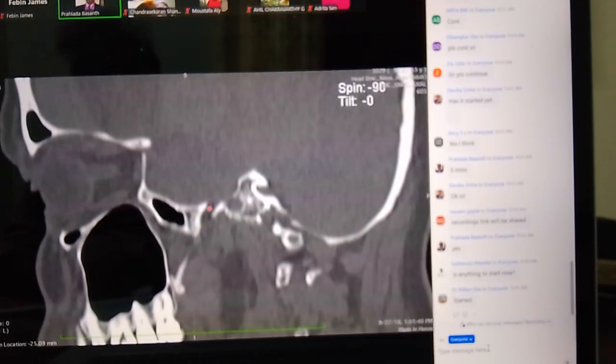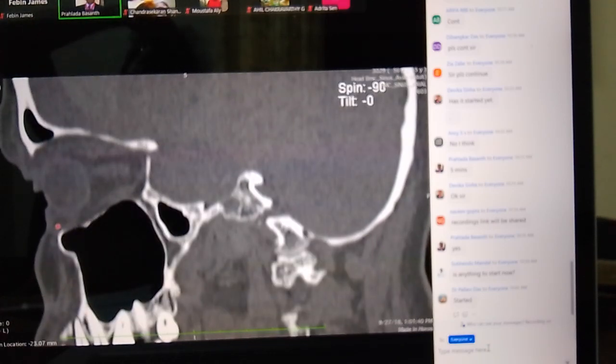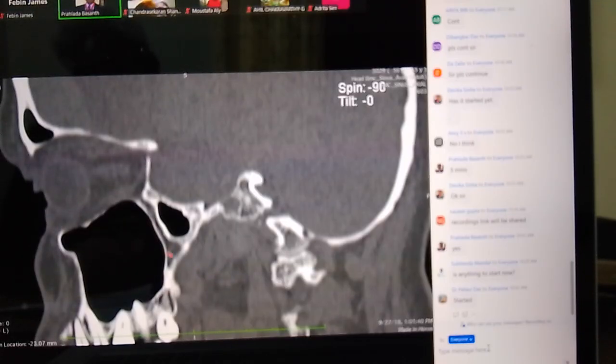Still the foramen ovale here. So further medially, yeah, infraorbital fissure, and this is the pterygopalatine fossa, maxillary sinus, orbital cavity, frontal sinus. Okay, frontal sinus, and the foramen ovale has disappeared. Okay, this is the pterygoid process pneumatization. This is the pterygoid process. Okay, and the infratemporal fossa medial portion.